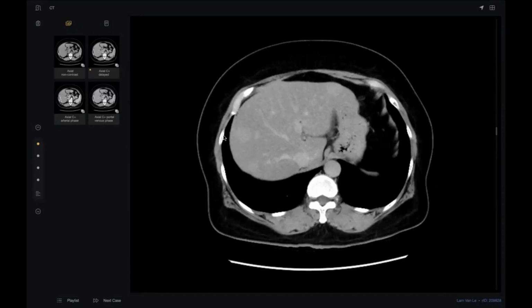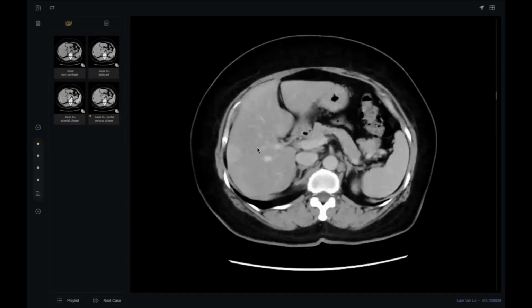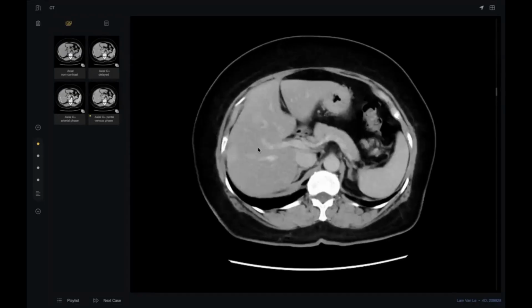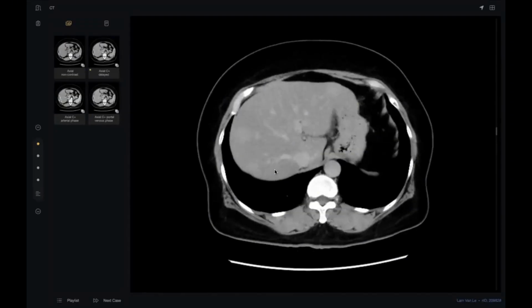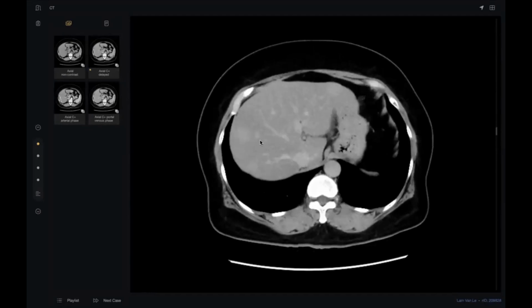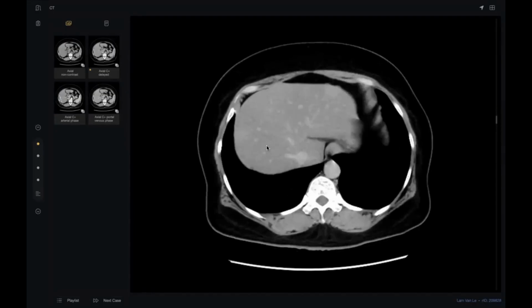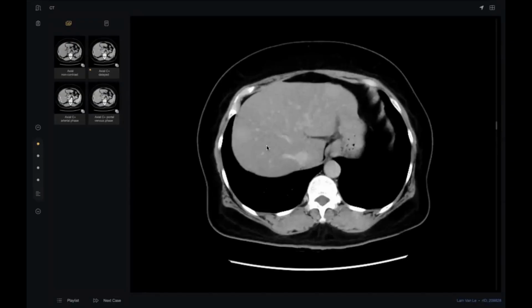I think that these might be hemangiomas. Are you sure, doctor? In the arterial, there is marked hyperenhancement, then less here. It didn't show a significant washout, but the contrast is not increasing, and in the delayed, the contrast is not increasing. It is similar to the liver parenchyma, although slightly hyper. So, what is your opinion?